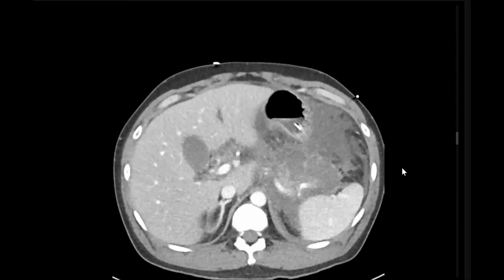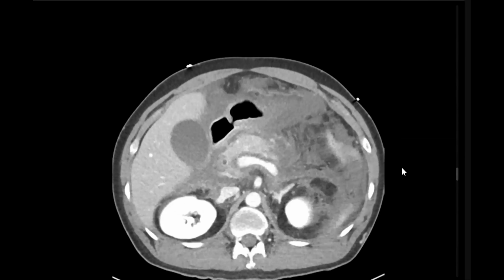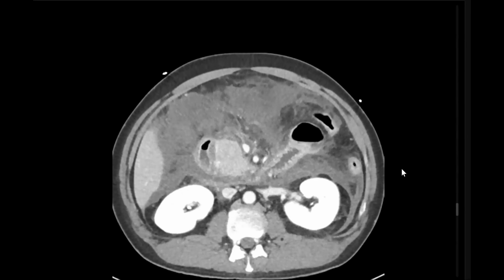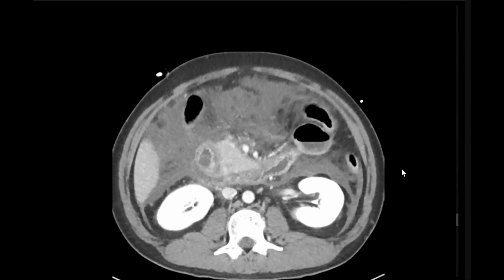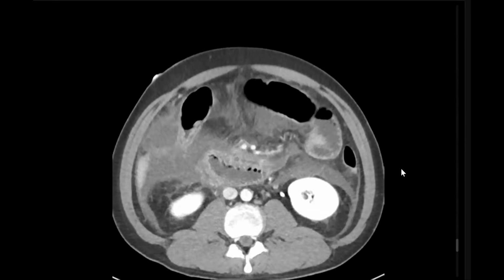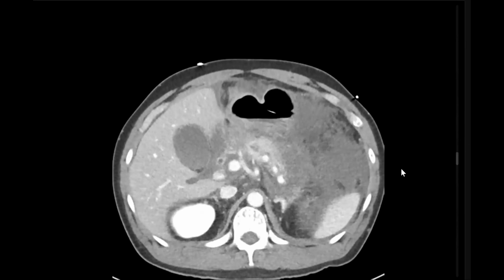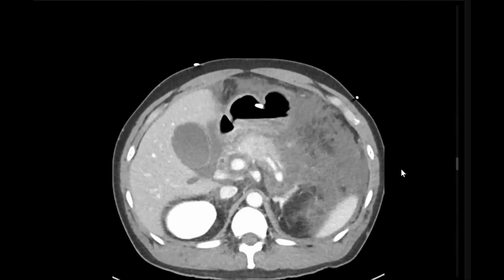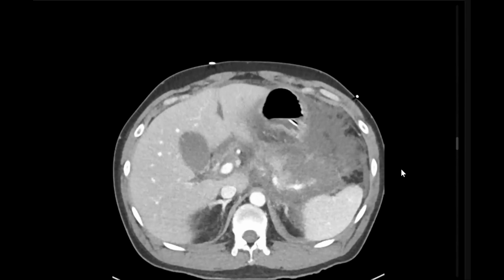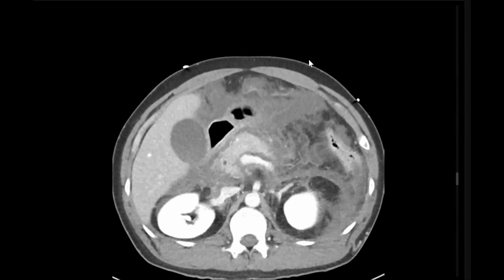I would check the arteries, superior mesenteric artery, to look for any SMA pseudoaneurysm, which can develop as a possible complication. What other sites for pseudoaneurysm formation? I think splenic pseudoaneurysm, and gastroduodenal. Splenic and gastroduodenal can be more common than superior mesenteric.